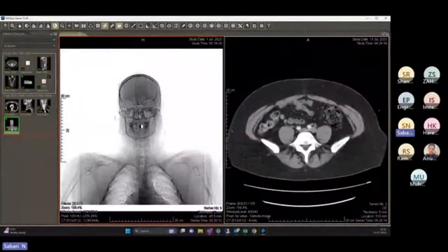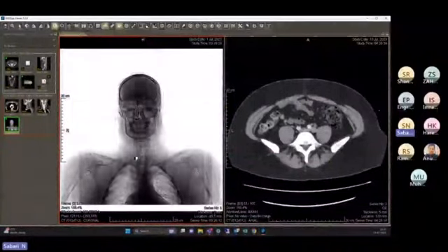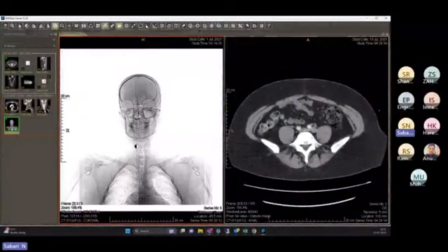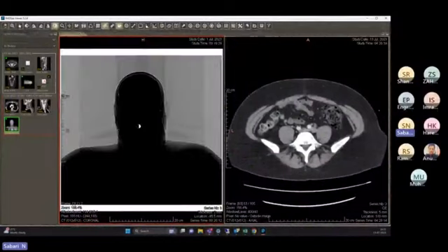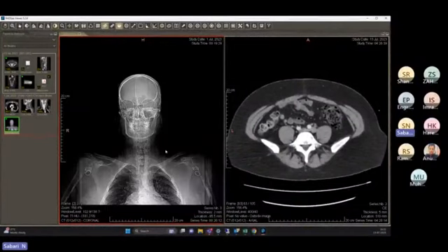They used that function frequently and they saw, okay, this is the thing they added, because once we convert everything into technology and digital, they cannot come out from that immediately. Still they are happy to view it that way. The same thing: even though we converted into digital, technology-wise they can still use the invert option to feel the same way the images are viewed on the film box.